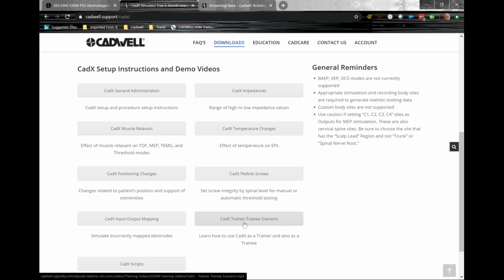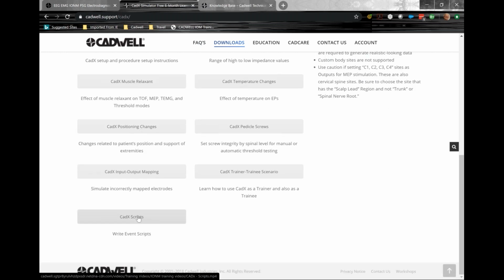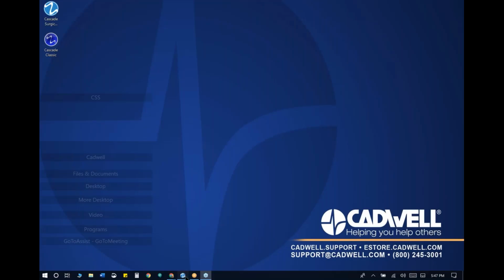So here's the trainer-trainee scenario that you can use to then view and get an understanding of how to create the scenarios that you would use to assess somebody else. CADX scripts, I'll briefly talk about those, and Cindy does a great job of explaining those, but I'm going to take you back to our Surgical Studio application here.